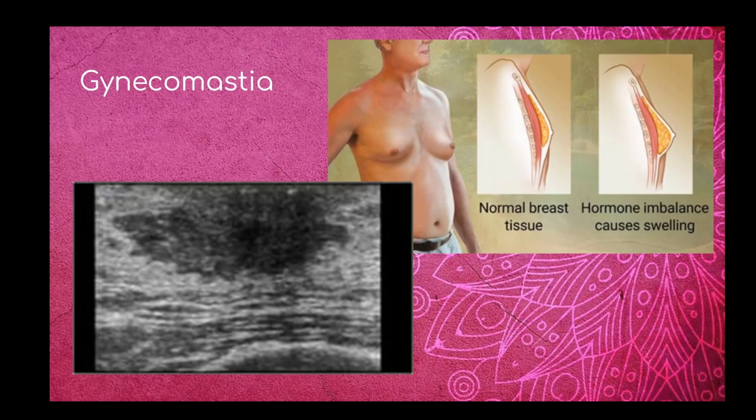The other thing that I really want you to focus on is just in general, what are the benign characteristics? Round, smooth-walled, wider than tall, anechoic to isoechoic to hyperechoic. Okay? Those are our main benign characteristics. Memorize those.